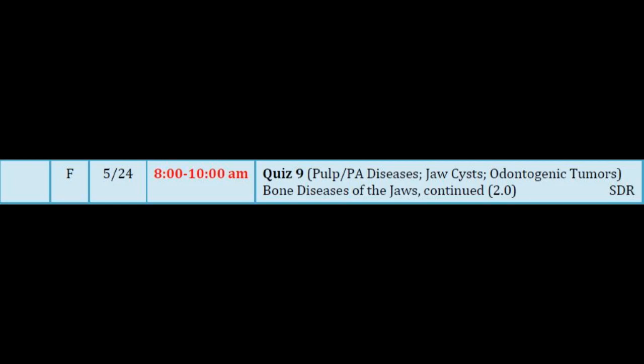This is an older adult female with lots of lesions. It's a panel with lots of artifact, but there's 1 maxillary lesion. There's another maxillary lesion, and she's got some back here. They don't show up so well. But look at all of the lesions in the mandible. Lots of them. Large, confluent, at least partial radiolucent rims. Where are the teeth? They're gone. And we tend to see patients where they weren't diagnosed properly early in the course of disease.